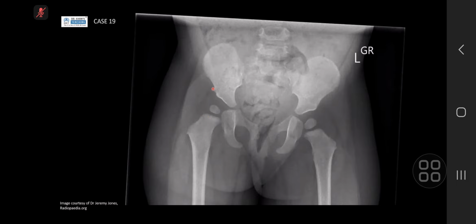Another small thing you can think of is the acetabular angle. Okay, you can draw one here. So using this, I think it's Perkins line, you measure the angle between here and here, and then the angle between here and here. So this is a steeper angle than this. Just remember, as you age, this line should come down, making it flatter. But this is a slightly larger angle.